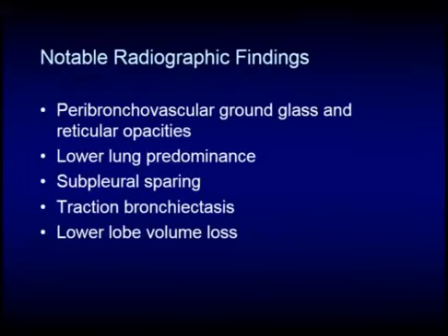So chronic hypersensitivity pneumonitis would more often give you reticular features with areas of mosaic attenuation and air trapping, and Rob will go over that in a bit. But really this was most consistent with NSIP.